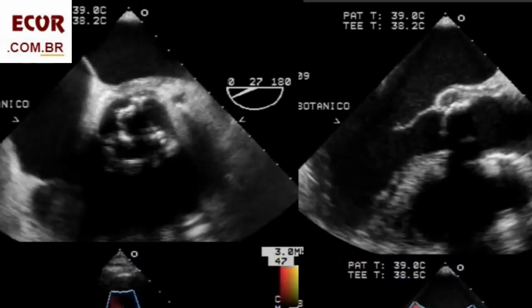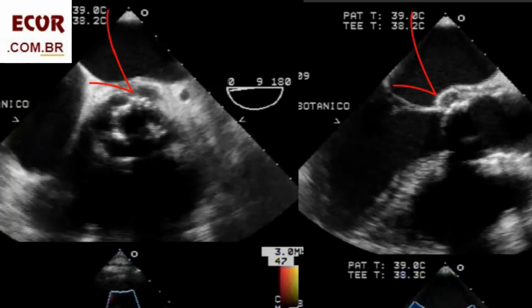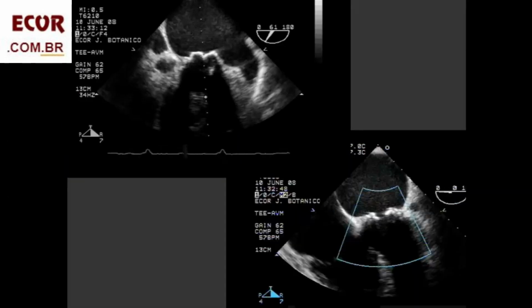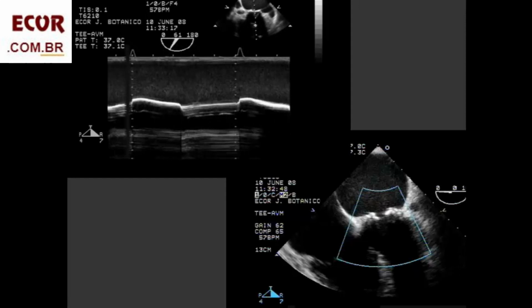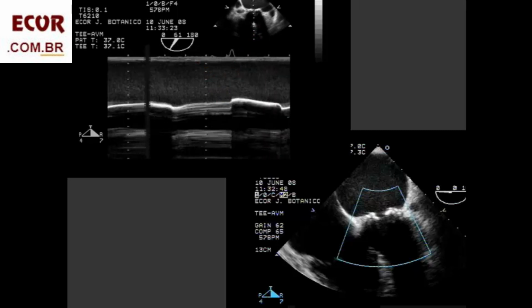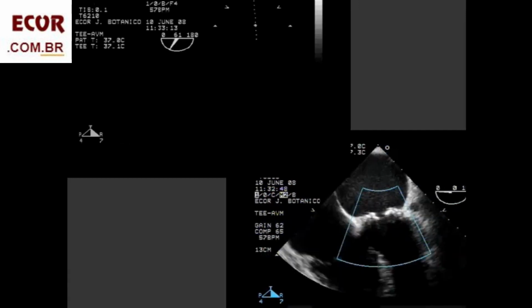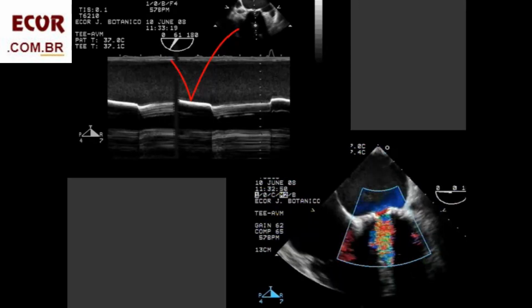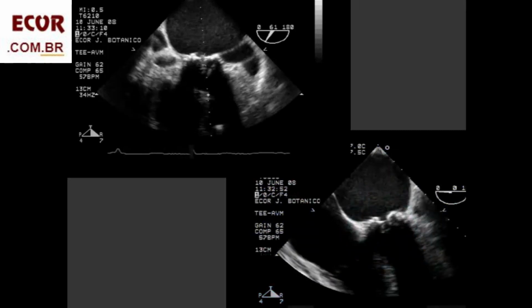Endocarditis in a biological aortic prosthetic valve with ruptured leaflet and an abscess in the posterior aortic wall. Important prosthetic regurgitation. Mitral bioprosthetic valve with pannus and several regurgitation jets. Notice that during diastole, the echo dense trace in the M mode is formed by only one line, different if it were calcium, when it would show several lines, and not a vegetation, where it would have a smudge appearance and the line would have a torn paper aspect.